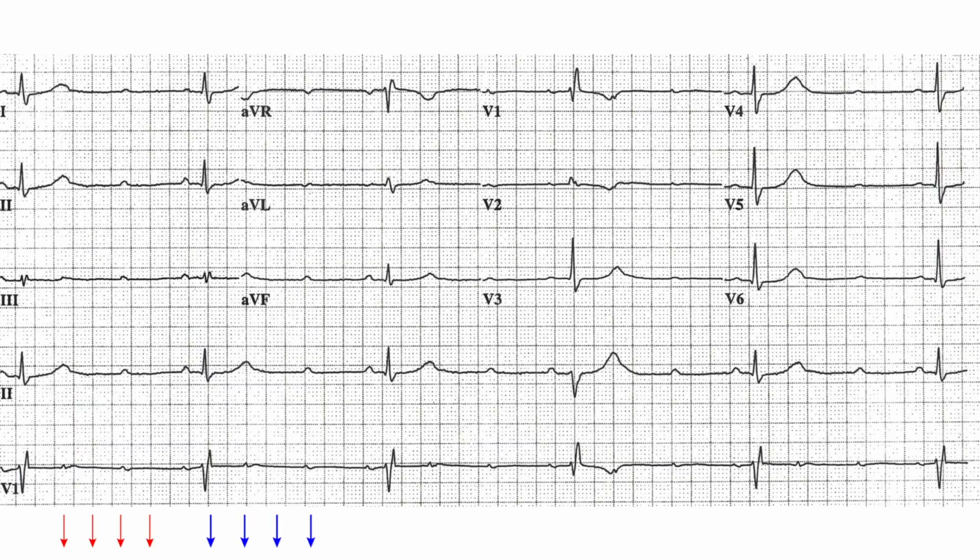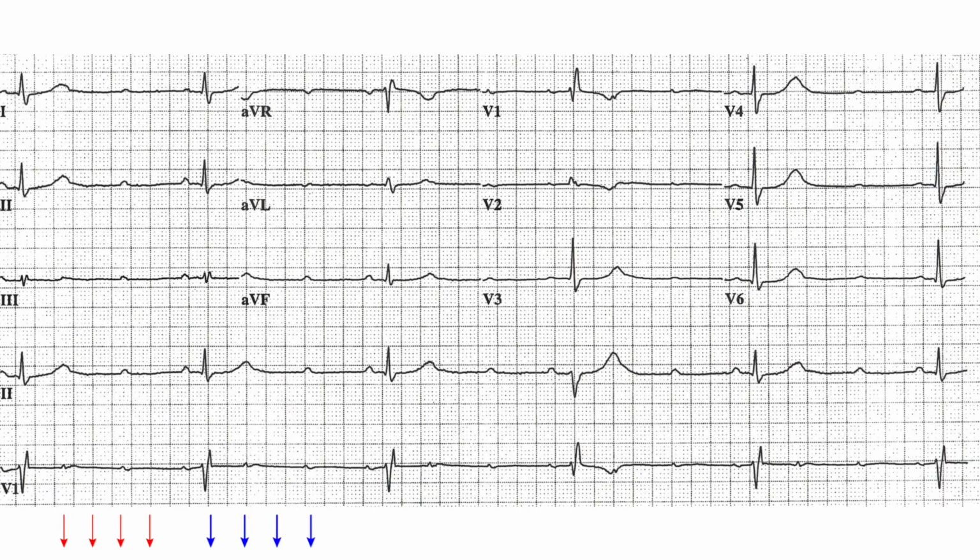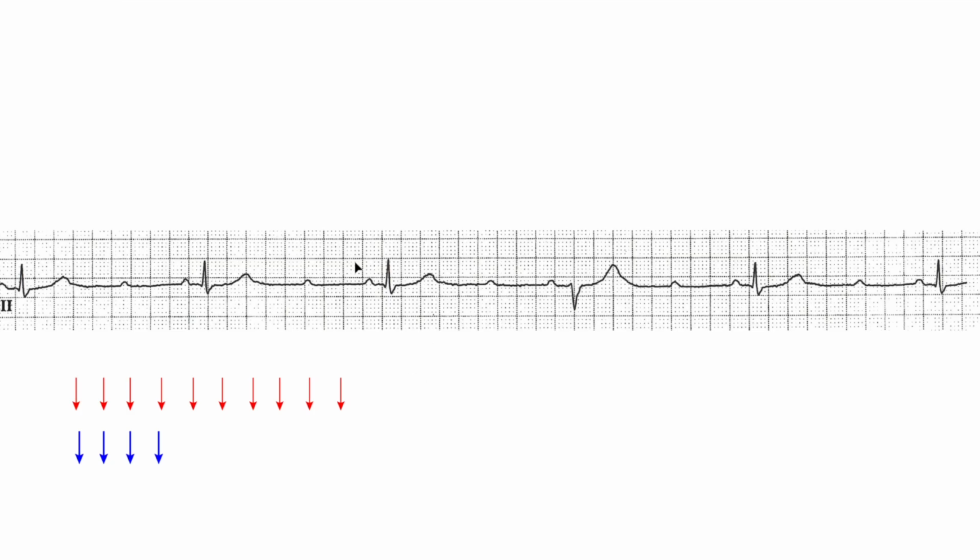Today, we're going to be taking a look at this 12-lead ECG, right? We're going to be breaking it down. Actually, we're just going to start off with a single lead and jump right into the 12-lead. Kind of missed the in-between step with a couple of different channels, but that's not going to take away from the lesson.